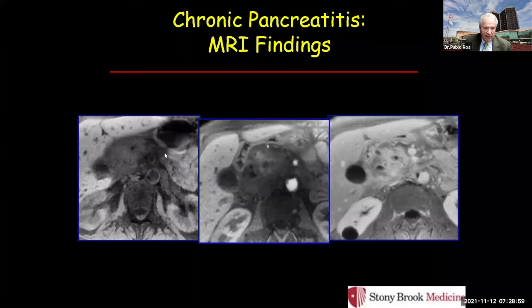Examples of chronic pancreatitis. You see here the appearance in T1, a little bit of modest enhancement of the area of chronic inflammation, and this is the appearance in T2. That will not escape anybody: to understand how difficult it is, by MR or CT, to differentiate focal chronic pancreatitis from a pancreatic neoplasm, that to this date is not 100% possible.